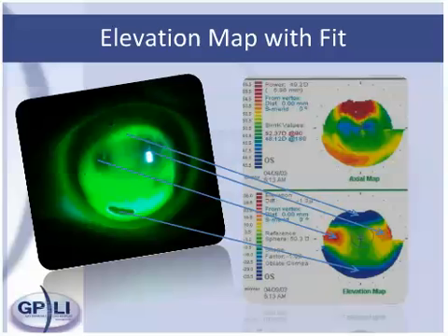This map demonstrates that flat areas can be high and steep areas can be low. Don't forget, the contact lens is the original topographer. If you wonder what your fluorescein pattern is going to look like, you should always look to your elevation map, not the axial map. Contact lenses will typically center over the high areas on the cornea, not over the steep areas on the cornea.